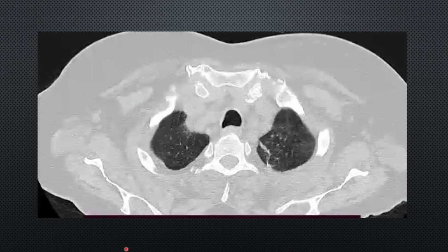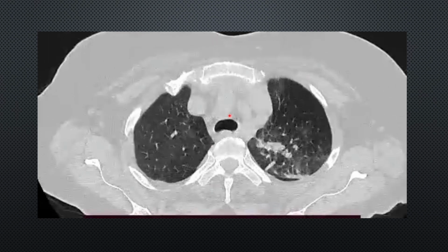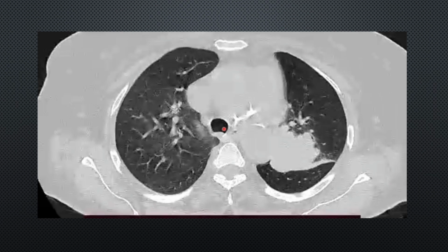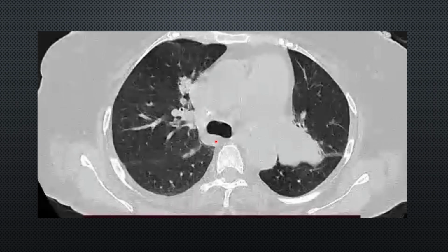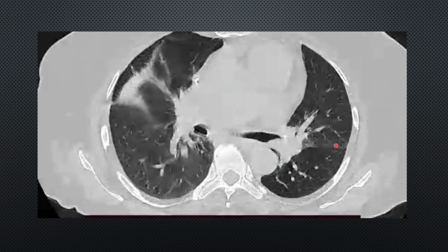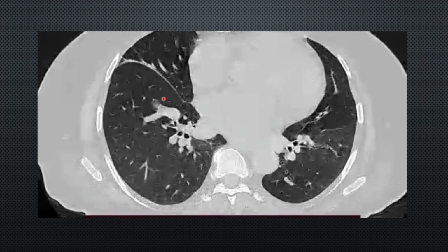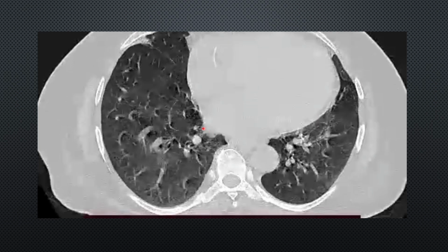So when we are scrolling, we can identify the trachea. It is now going to divide, and we are seeing the fissure. We just saw a fissure here. Now is the division. We can see some bronchus. We can see the oblique fissure here, and that's it.